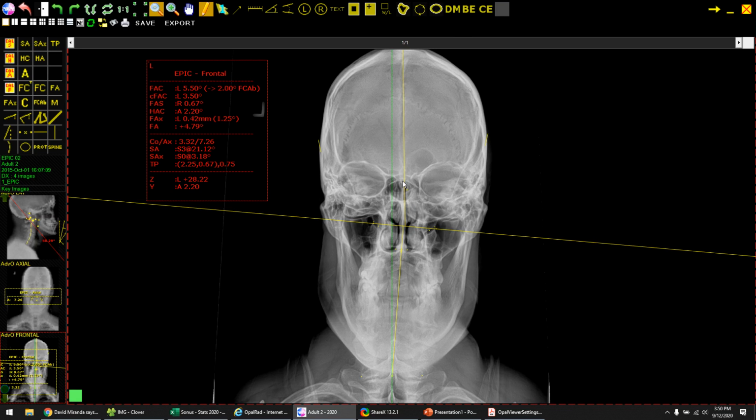So the side that we adjust on is the side of the acute angle on the top. So you could call this the upper angle. This is the lower angle. Actually, no, it looks like the acute angle is actually on the right. No, it looks like it's on the left. It's kind of interesting.